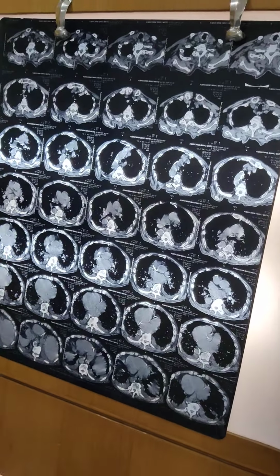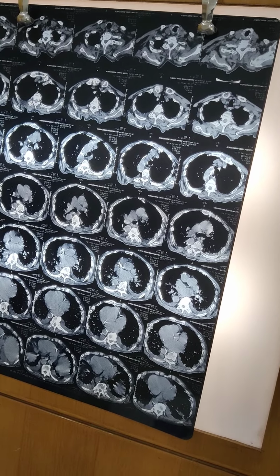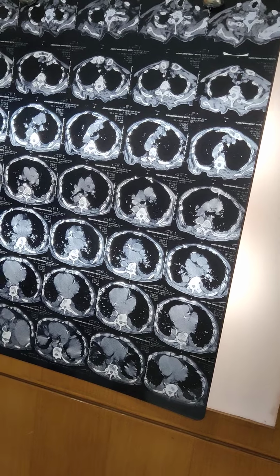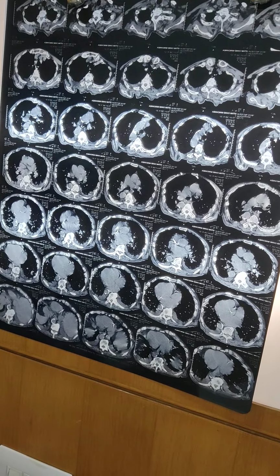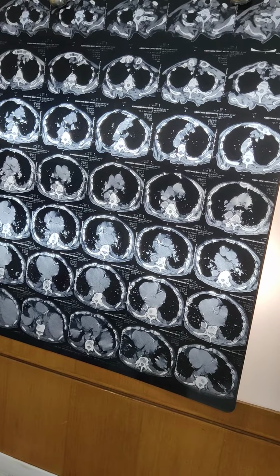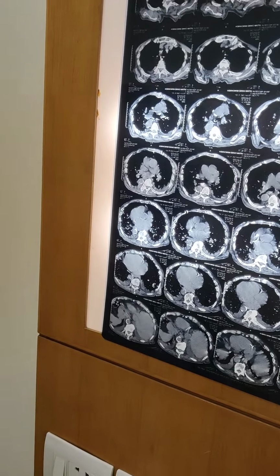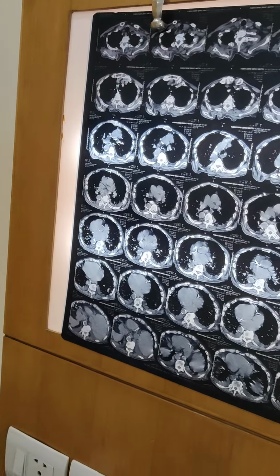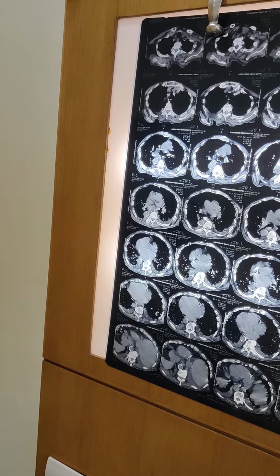So whenever, in these people, we are getting fluid overload also. We have to see whether it's either because of COVID or because of secondary changes, because this man has pro-BNP of 30,000. So when you have this kind of changes, on top of it, you have to be very cautious about giving fluid, because he's anemic. These people can easily go into fluid overload. So you have to be cautious about the fluid overload. So it's unlikely because of symmetrical changes.